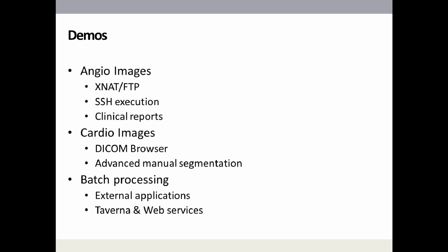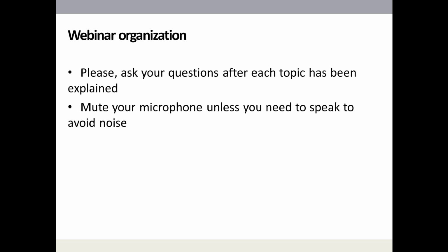The second use case is cardio images. We will use a cardio image to show you the advanced manual segmentation feature, and finally we will see the batch processing using another cardio image. Okay, so we will start with the webinar.